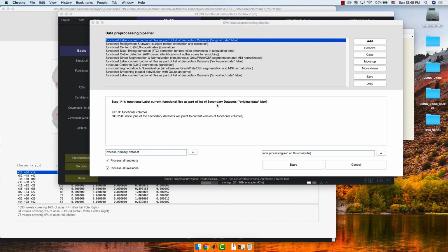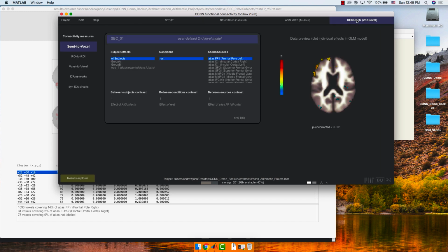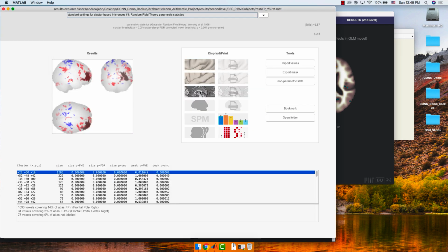Up to you. Upside, you get to really see where these activations lie, these correlations lie. Downside, it takes a lot of memory and takes a long time to do. So I would only recommend that if you have access to some kind of computing cluster to speed that up. There are so many options, we can't get to all of them, unfortunately.